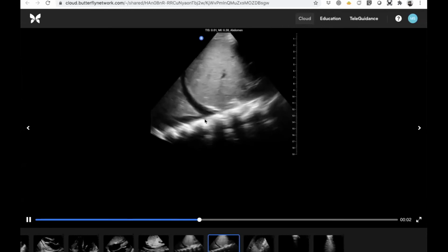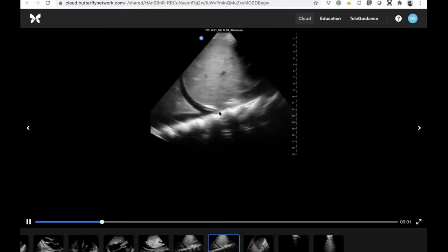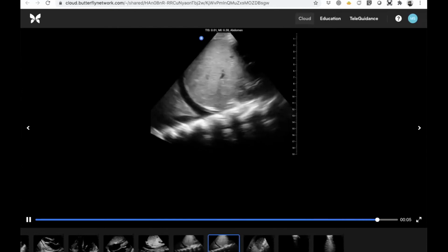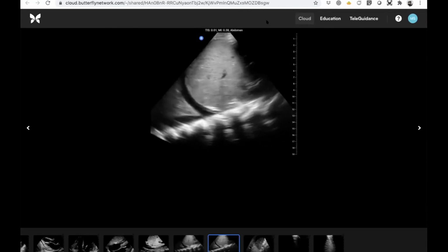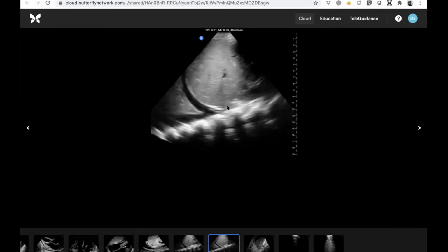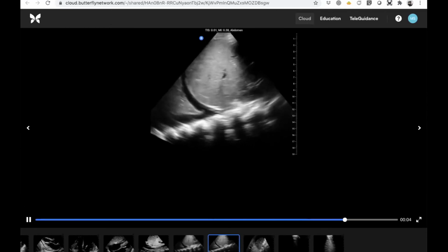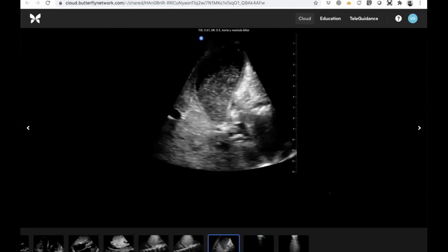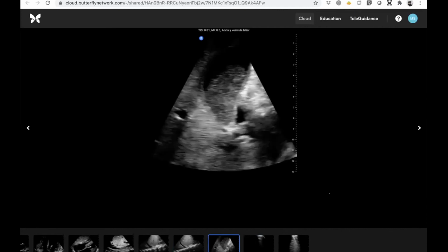So you don't need to see that to confirm an effusion. And you may have an imaging plane that doesn't show you the spine. But if you ever see the spine going up past the diaphragm, I think that's a great call to attention to pay some thought to what's happening in the right chest or the left chest if you see it on that side. And then we've done a lot of biliary today between contracted gallbladders and common bile ducts.